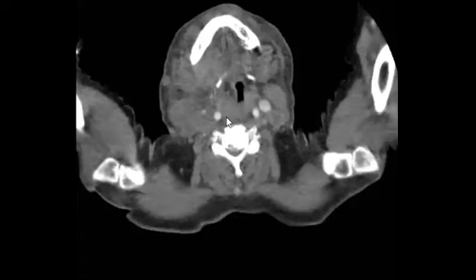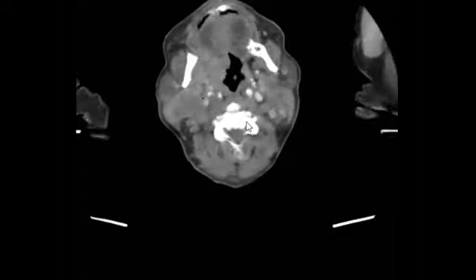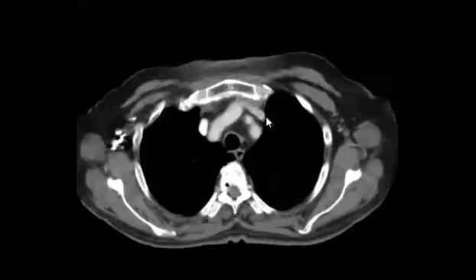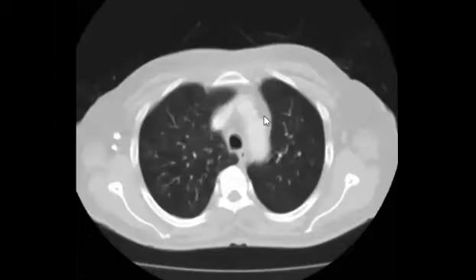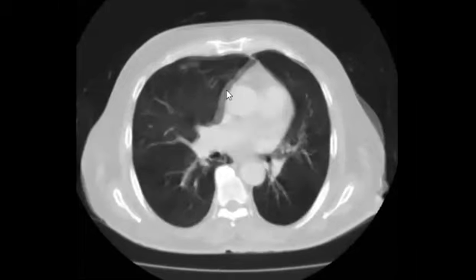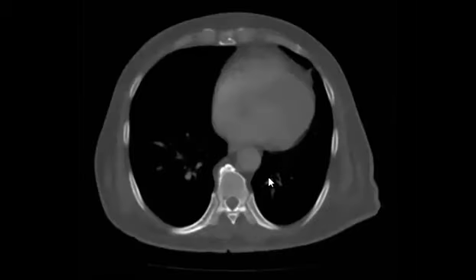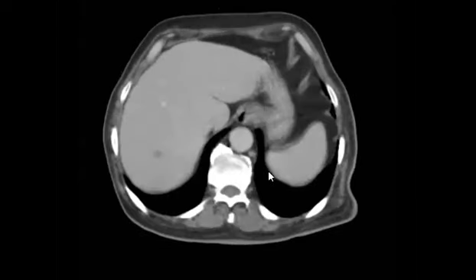You should focus on this. And the lung, as most of you mentioned, there are some lung tumor lesions, maybe metastasis. Maybe the big one is this one, which is pleural based, and the patient already has some technical problem with motion artifacts. But at least you can mention that there are some bilateral nodules.